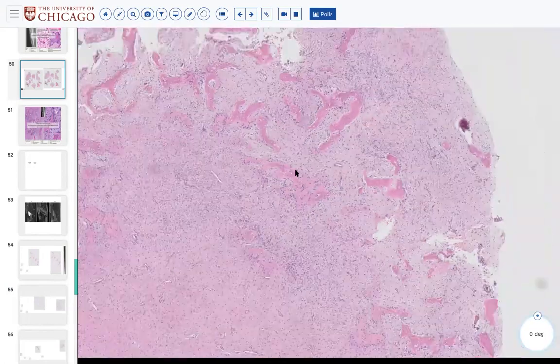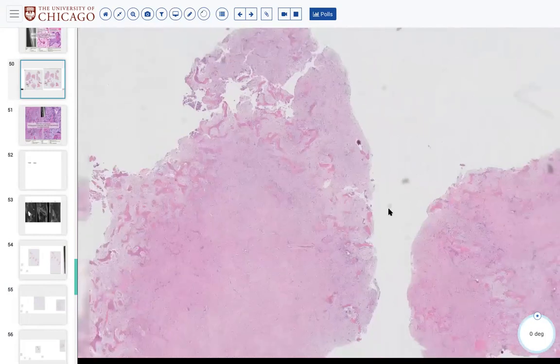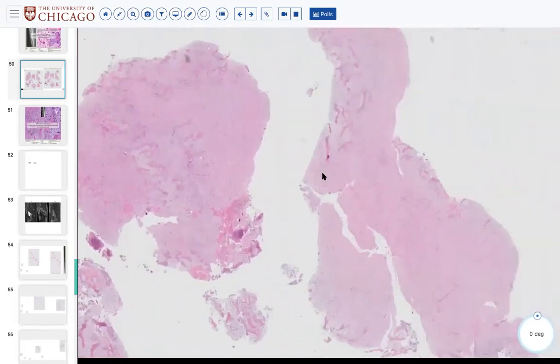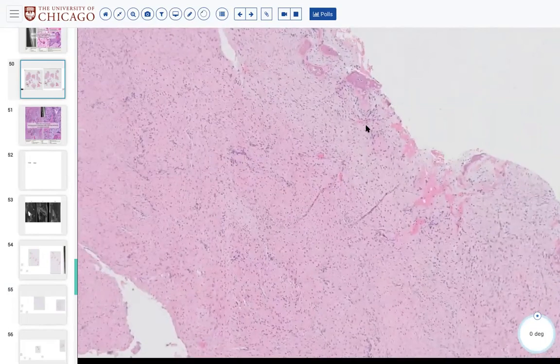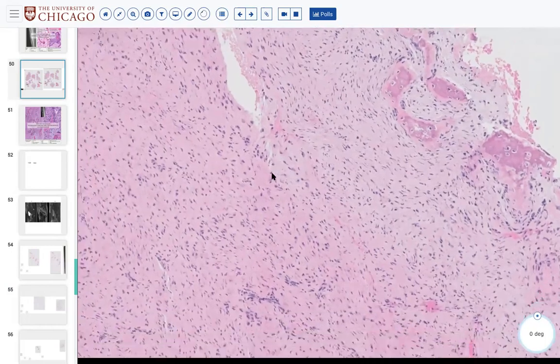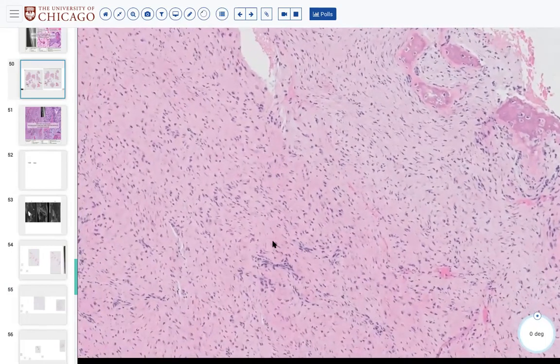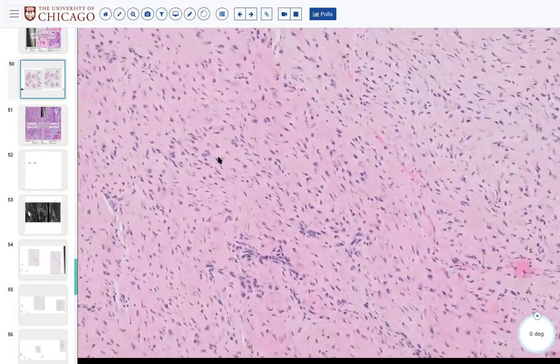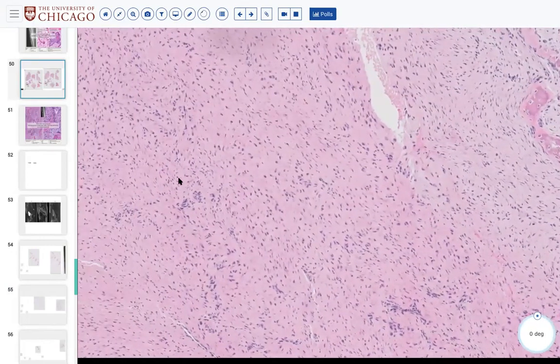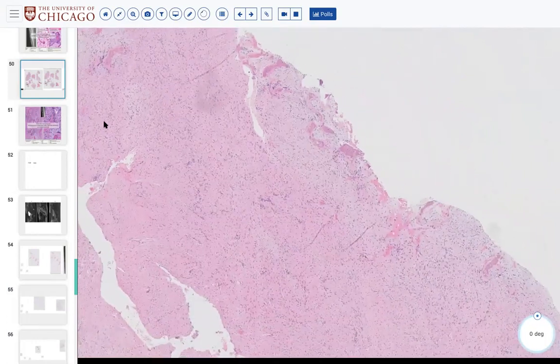So does anybody know the name for this one? That's the anatomic correlate to adamantinoma, but without the epithelial islands. Ossifying fibroma, osteofibrous dysplasia. Yeah, osteofibrous dysplasia is the more accepted term in the long bones, exactly.